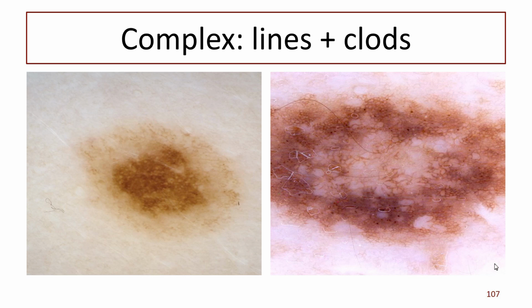And this one has rather a strange congenital nevi. Now, congenital nevi, when you look at the dermoscopy, are often very strange, so probably it's best, when you're a beginner, to leave your congenital nevi for later when you've become more experienced. Just ask the question, how long's that been there? And most people will say, my mother said I was born with it, but occasionally people haven't a clue.